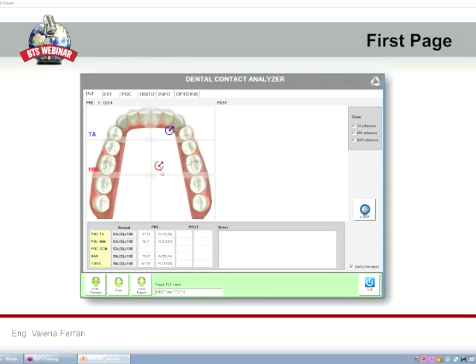The gray stripe represents the normative band. In particular, the vertical one is related to the POC index, and the horizontal one is related to the barycenter index. So the crossing of the stripes represents a perfect occlusion, and the rectangles highlight the normality range of both targets.